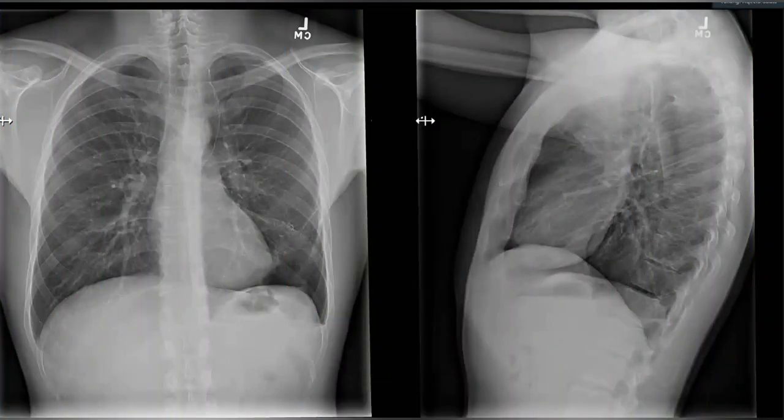I'm provided with the frontal and lateral projection chest X-ray of an adult patient. There is some elevation of the cardiac apex. However, the cardiac size appears normal. Okay. So what is the very significant abnormality in this chest radiograph? What do you think? It's an acute problem.